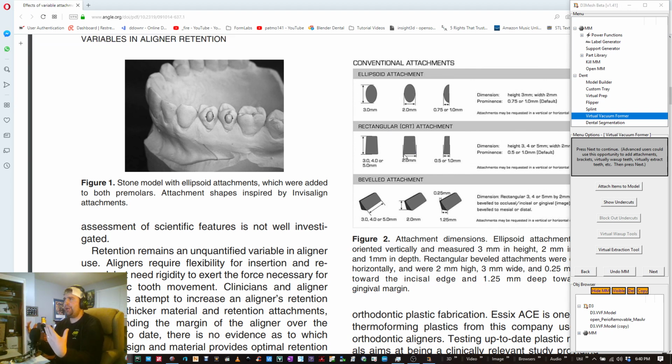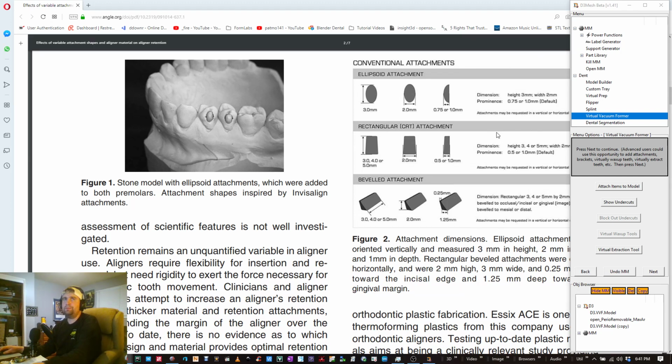objects from scratch. It's not hard to do that, but then make them in such a way so they'll be compatible with the Mesh Mix add part algorithm that it uses. And so I'm kind of at its mercy there. I don't really have any control of that. So for the vast majority of these, I got them to work, but there's a few still that I need to go through and revise and make them work a little bit better. But this is where I got my info from.